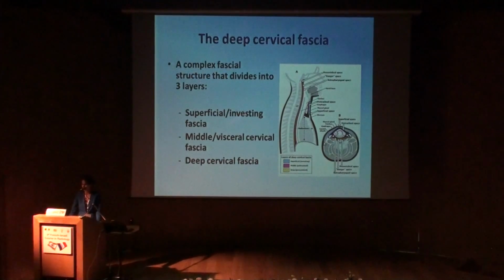Okay, and let's start the black line over here.